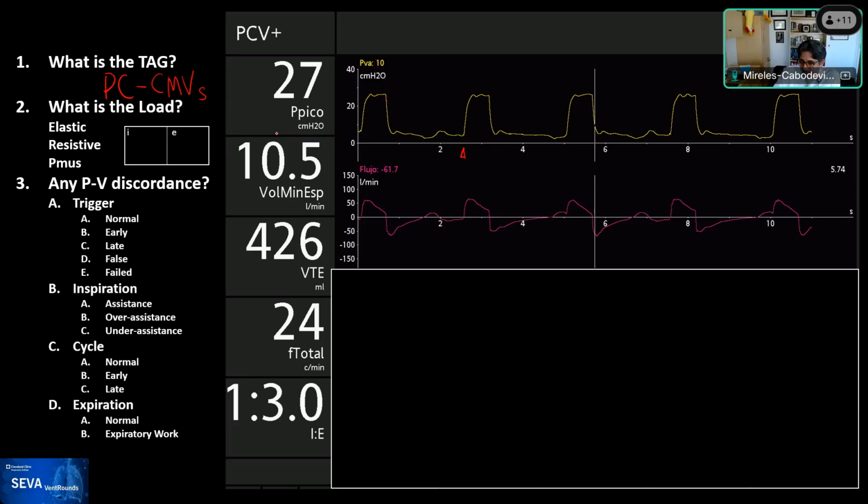I see a comment. It seems that the trigger variable is P, even though there is no patient-triggered breath. And that's possible. And I presume you're saying that, Ariel, because you're seeing the pressure, the flow crossing. But I would say that unless there's any other marker, if you set the flow threshold very high, that may cause that. And I presume that's what you are referring to. So it's possible that it's pressure, but just remember that an inappropriately set threshold can be the cause of this. Very good. Good points. Thank you, Ariel, for bringing that up.